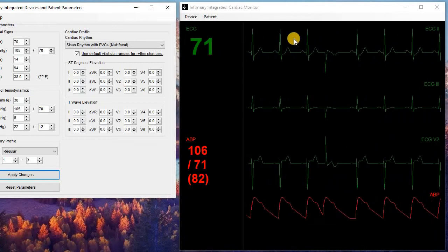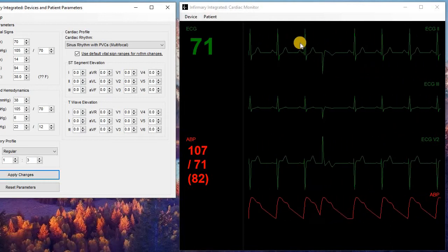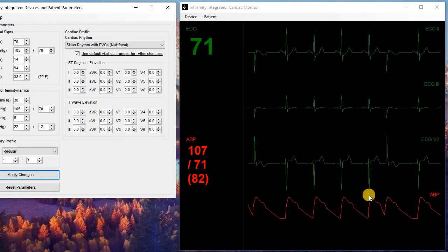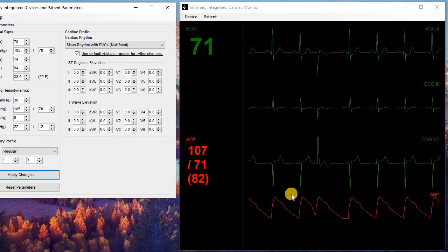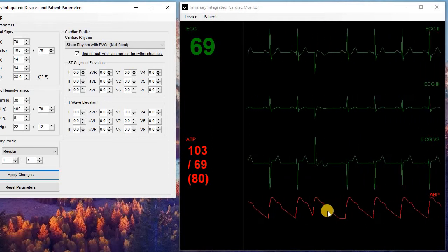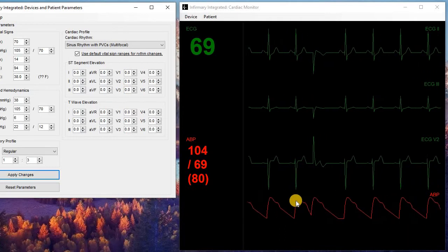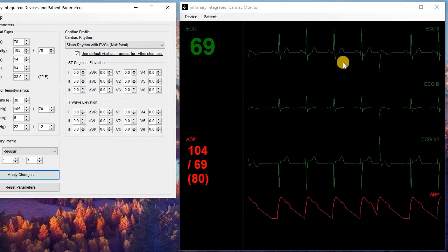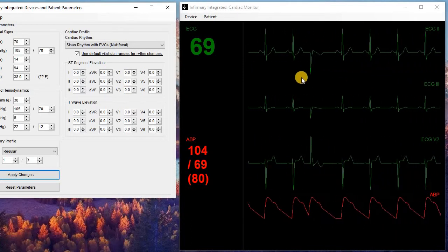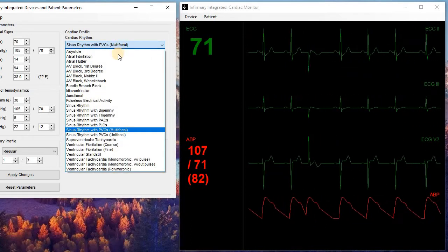Note that on every perfused contraction, or every contraction of the myocardium, a rhythm that relies on pressure and perfusion, such as pulse oximetry or arterial blood pressure, the waveform will only show an actual wave when there is myocardial contraction modeled through the patient.